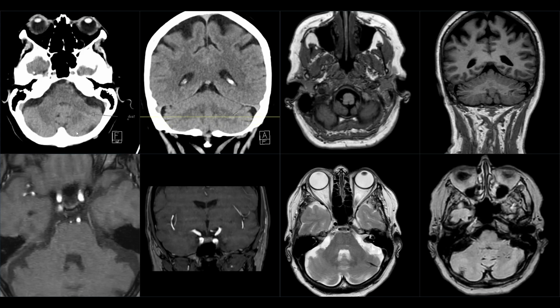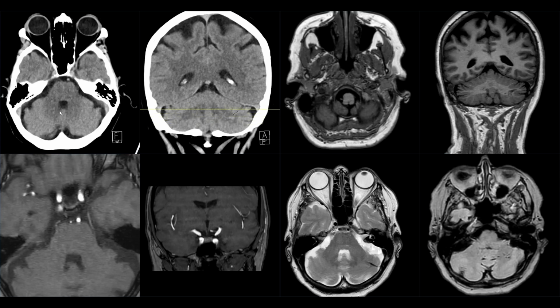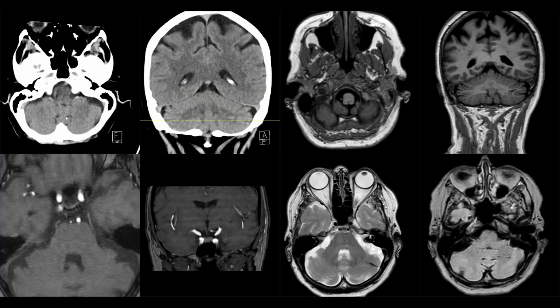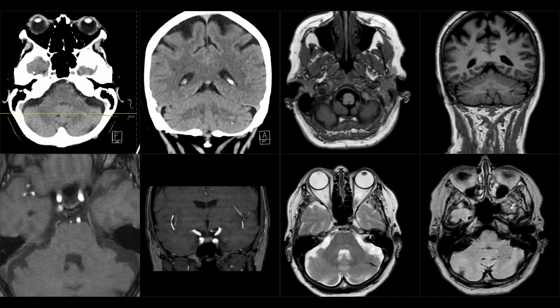Hello, this is the case of the normal vascular anatomic variant that has been well spotted by the doctor evaluating non-enhanced CT of the brain. You can see the doctor pointed out a high density structure in the cerebellum on the left side and even suggested perhaps it is a DVA and suggested confirmation with the MR.